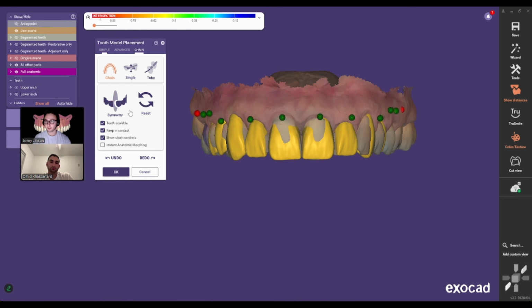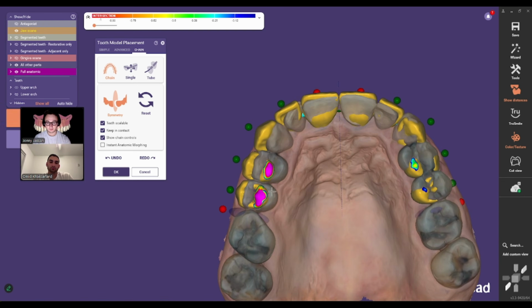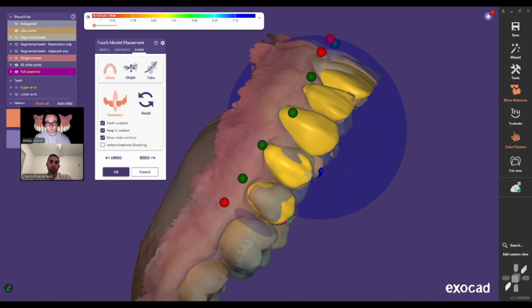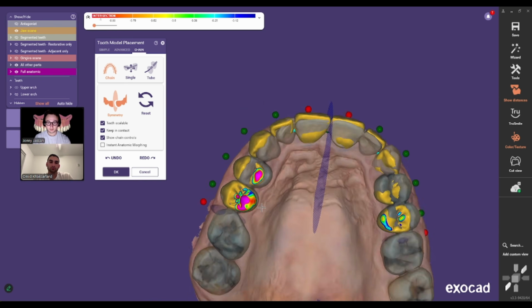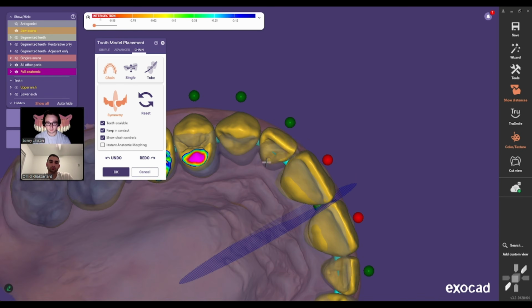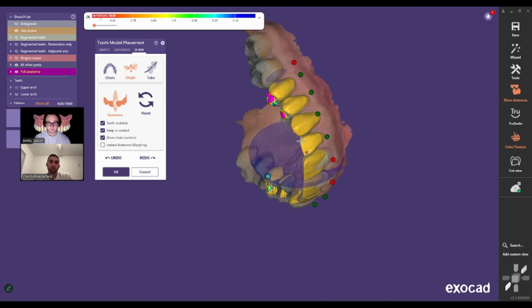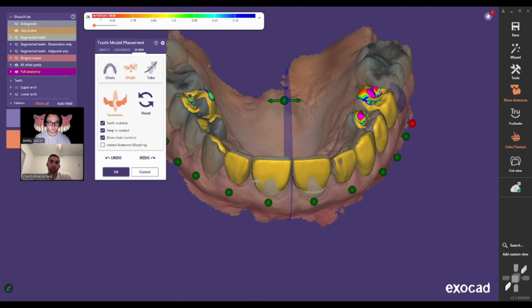And then I'm going to go to chain, symmetry. I'm going to lock 8 and 9. I'm going to move that distal disc, and then I'm going to increase the size, and you'll see both sides are moving at the same time. And then I'm going to increase the size of the bicuspid. And we can address some aesthetic concerns now with the patient that she had, if she had any aesthetic concerns about what she desired on the case or what doc desired on the case. And then I'm going to get into the report after we have a wax up.